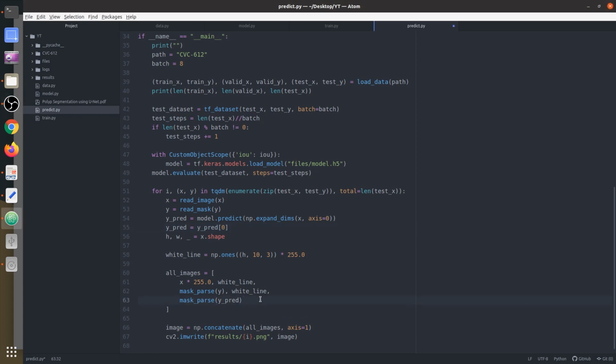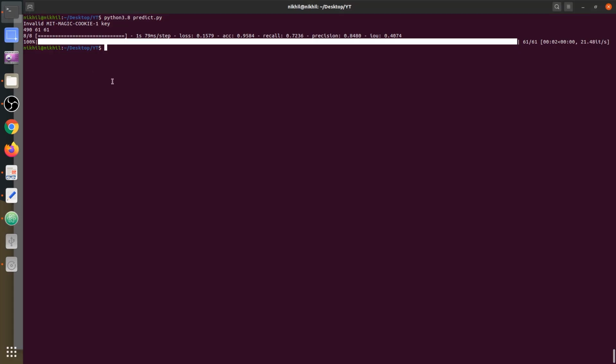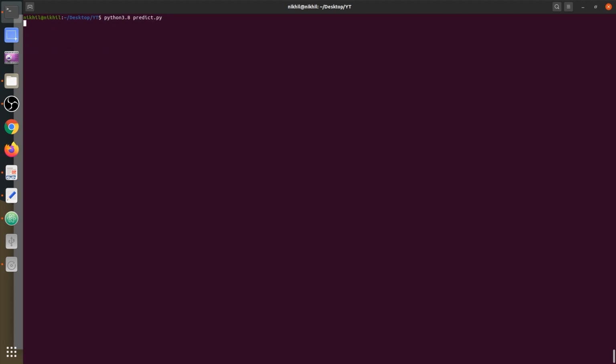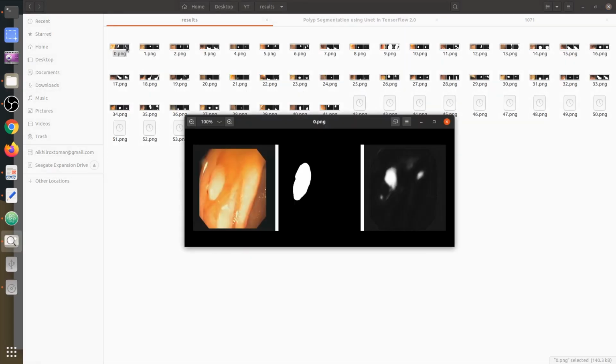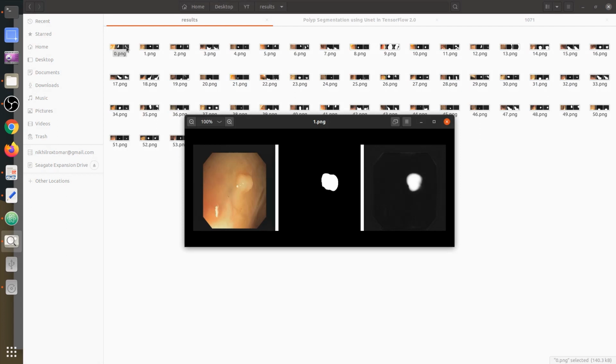And I know what the error is. I haven't applied 255 here. The value is between 0 and 1, not between 0 and 255. So the pixel value is divided by 255, so we need to multiply by 255. Now we can see the correct result. Okay, now we can start seeing some results.